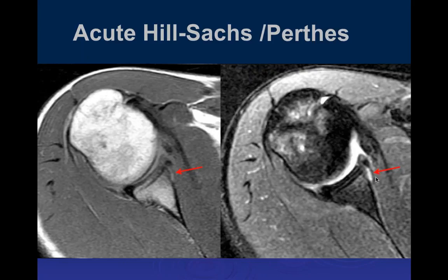The orthopedic surgeon doesn't really care. When they go in there and repair it, they'll just complete the tear and put in their suture anchors and do a repair. So the actual presence of the periosteal attachment, at least for most of the surgeons I know, doesn't really matter much, but I still describe it, and this is considered a Perthes lesion.